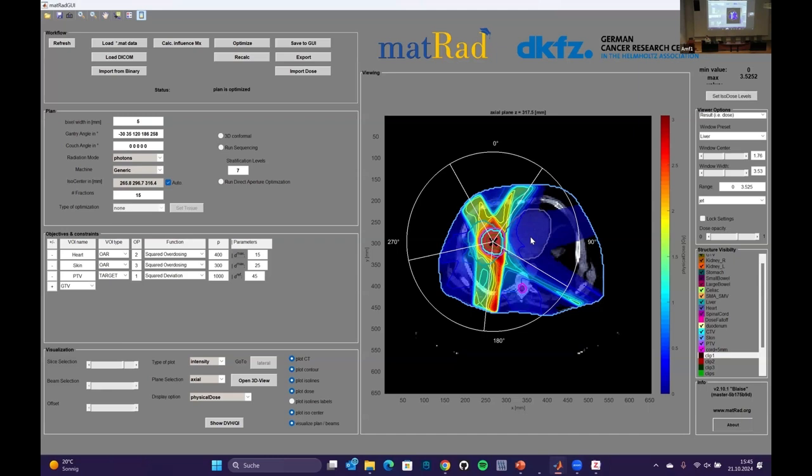So instead of letting you do the tuning here, they just give you a set of combinations of these importances and parameters. And you can then, after this lengthy initial computation, use sliders to move through the plans that the computer has generated. It makes it much nicer than adding something and then figuring out my whole treatment is blown and I need to go back and change something there and there and there, maybe add a new helper volume and so on and so on.